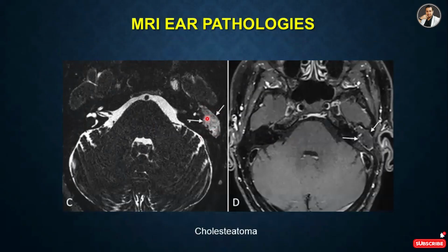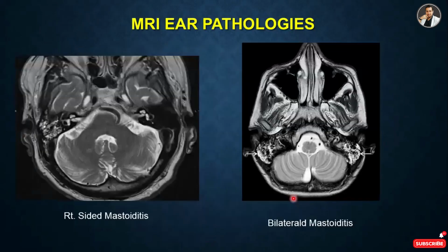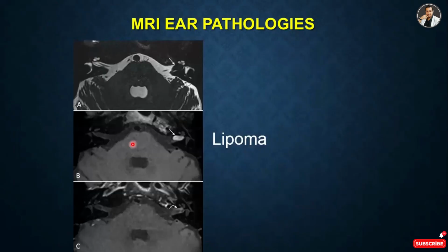There is a lot of problem. In the tumor. And the otitis in the middle ear and in the temporal bone. Infected. Then on the right side, mastoiditis. Mastoiditis on the right side. Bilateral mastoiditis.